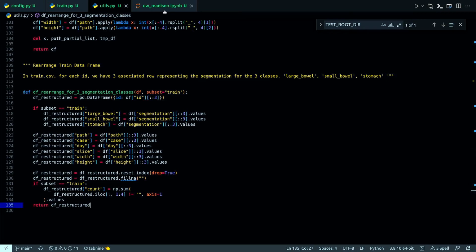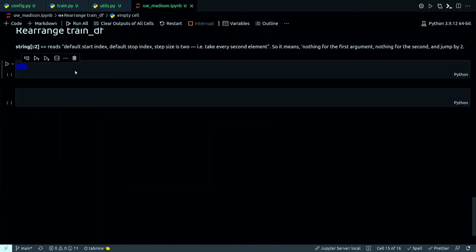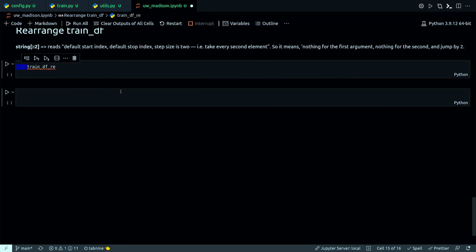Now come back to my train df restructured.